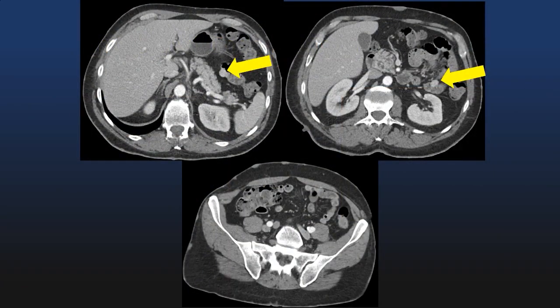Here's another patient with abdominal wall findings that are key to their diagnosis. Notice multiple soft tissue nodules within the skin, both anteriorly and posteriorly. This patient also has several small nodules arising from the submucosa of the proximal small bowel. This was a patient with neurofibromatosis presenting with multiple neurofibromas as well as gastrointestinal stromal tumors arising from the small bowel.